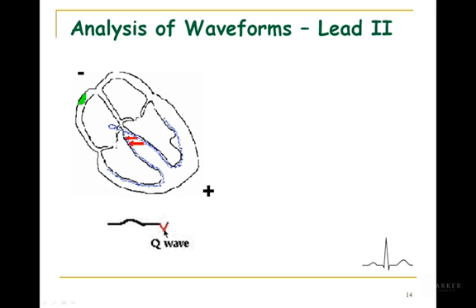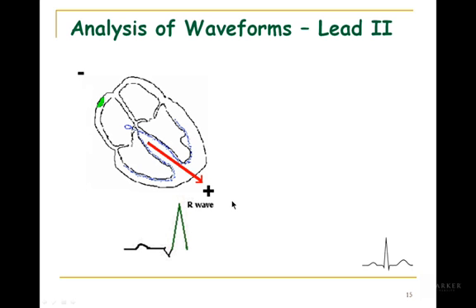Okay, so the Q wave is very small because there's not a lot of muscle, plus the fact it's running pretty close to perpendicular. If you don't see a Q wave, it is running perpendicular to the lead. Now the R wave is the big one. You can't miss the R wave. R wave, big, we got a lot of muscle. This represents most of the muscle fibers in your heart, from the apex up close to the base. So it's the majority of the muscle fibers within the heart.